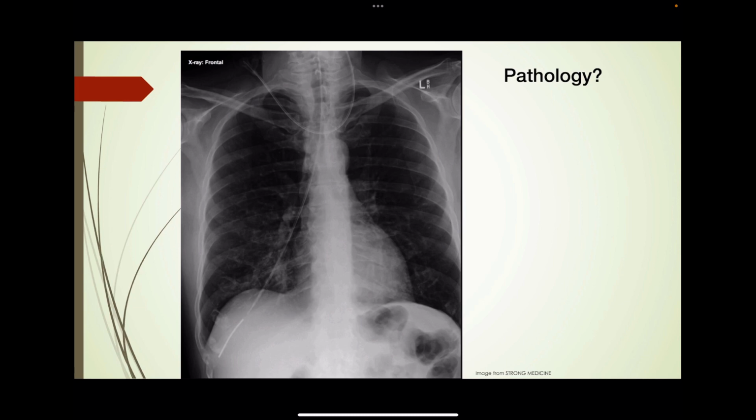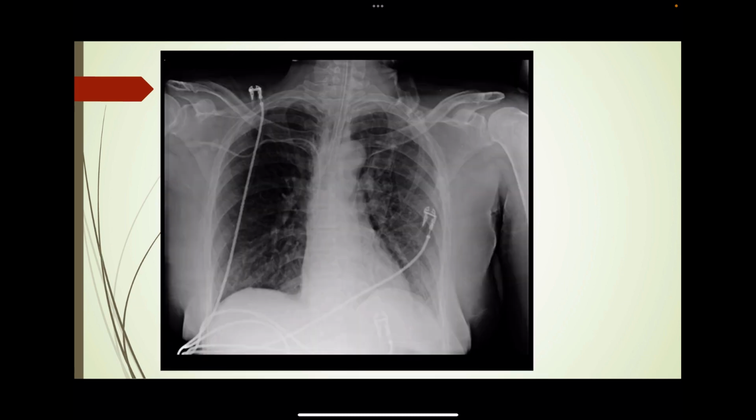All right. So, another chest x-ray. Trachea, A for airway, come down here. Looks like this is probably the carina right about there. You can see there's something in the airway. Looks to be an endotracheal tube ending right about here. B for bones. Bones look okay. Cardiac silhouette.